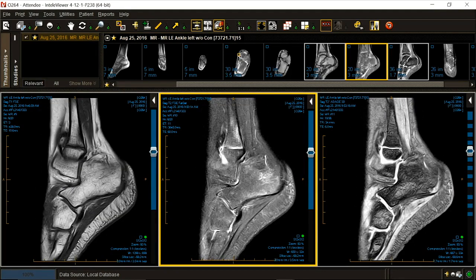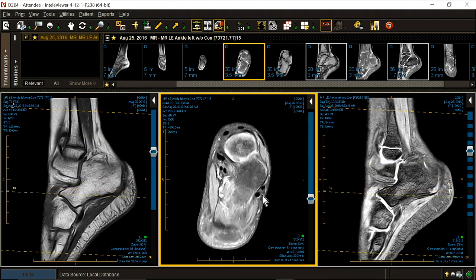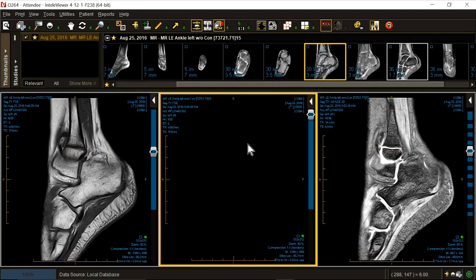They were concerned about her peroneus brevis. She does not have a peroneus brevis tear. Very few 19-year-old girls do. They were concerned about a growth plate injury.